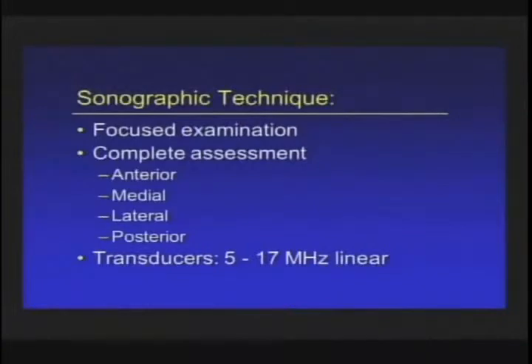So let's talk briefly about the sonographic technique of the knee. We covered this somewhat in the demonstration, but I want to emphasize a few points. One thing is to consider focus versus a comprehensive evaluation. Of course, when you have a focal clinical problem, you can focus your evaluation to just one area, but make sure that when you cover the one area, you cover all those structures in that one target area.